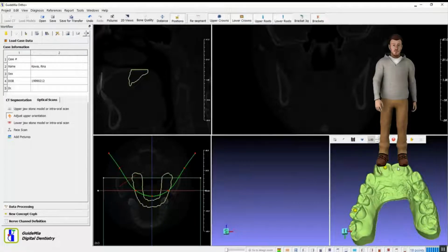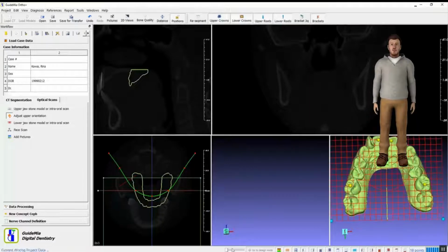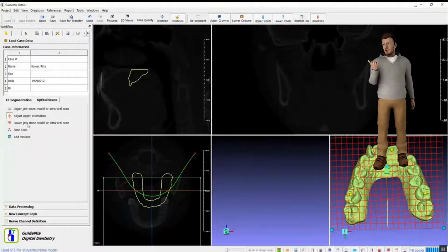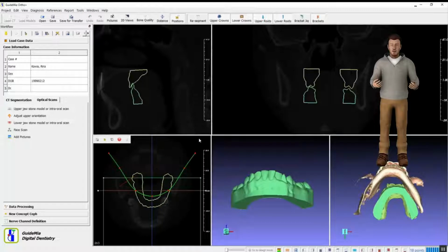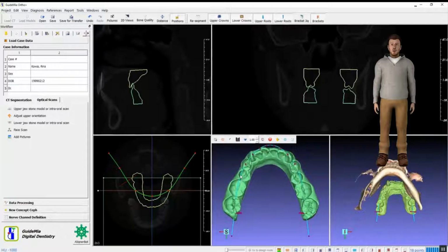Both scans have been processed into closed solid models. Unfortunately, the files have various quality issues, which we will show later. We will perform automatic fixing operations over the scans, but it is desired to have open shells instead of solid models. On the other hand, very often we receive open shells and want to trim and close them.